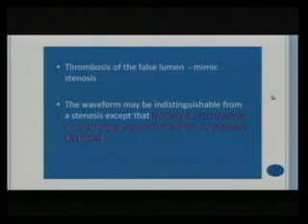So do remember, carotid artery dissection is more common in younger individuals, people who are more prone to trauma, like seatbelt injury, etc. Vasculitis, also these are congenital diseases. They usually start right from adolescence, so these can occur more in the younger population. So there is no plaque or hardly any plaque, yet there is a long segment stenosis. Whenever you visualize something like this, consider carotid dissection as one of your differentials.